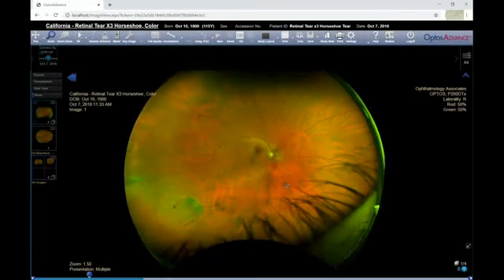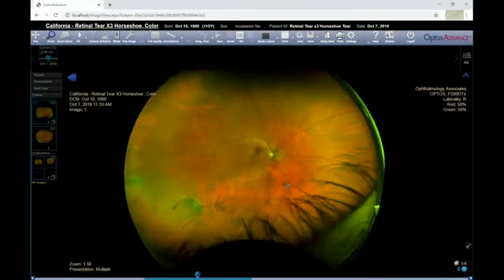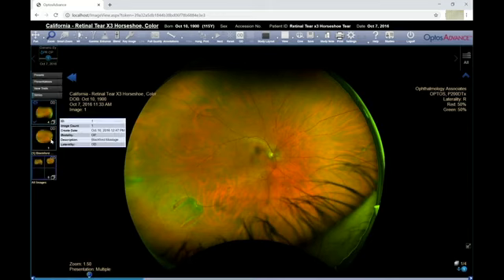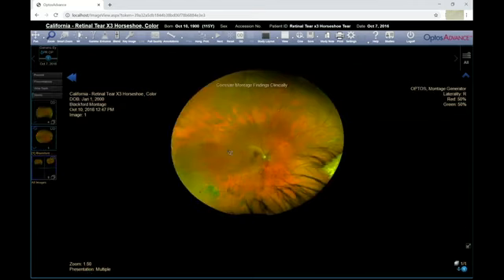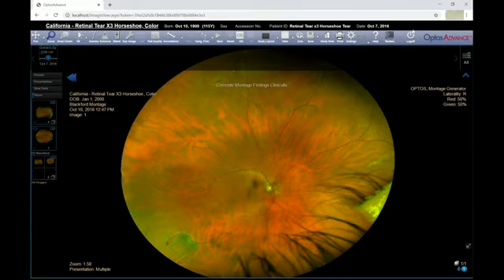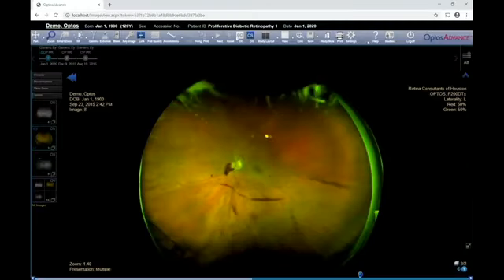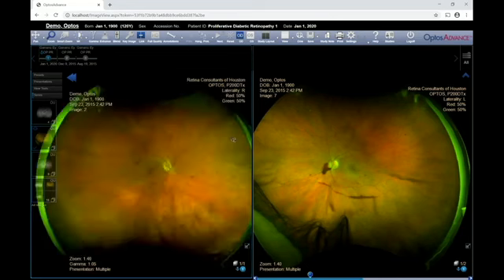If eye-steered images were captured, your software is capable of automatically generating a montage that can be found in the series navigation bar on the left-hand side of your screen. Click on the thumbnail labeled Blackford Montage and select OD or OS from the toolbar if necessary. Double-clicking the left mouse button again will restore the original study layout.